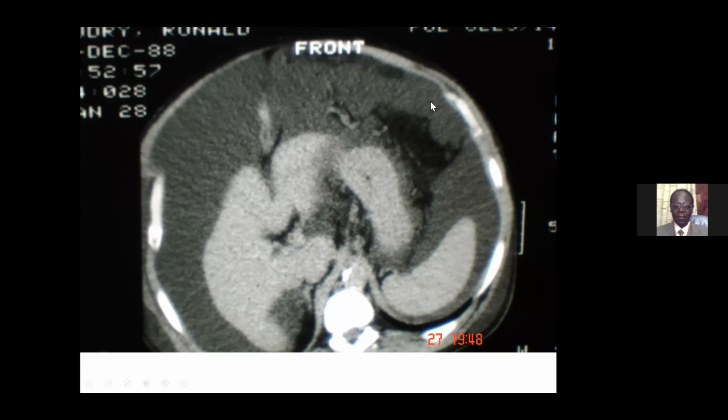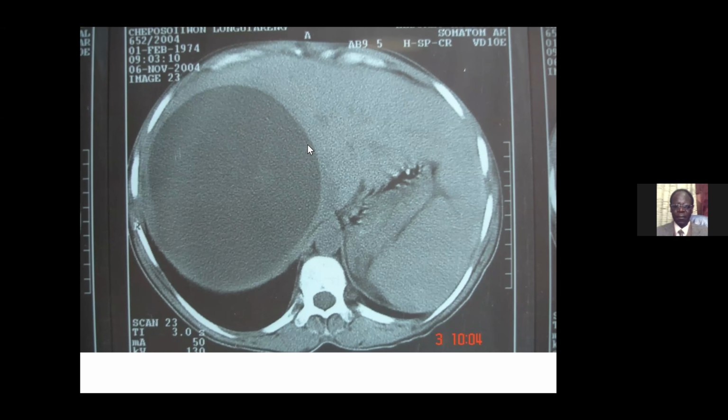This patient presented with abdominal distension. We did this CT, and we found a hypodense cyst, which was quite large in the right lobe of the liver. Look at the liver. The left lobe has been pushed all the way to the left costal margin, hepatomegaly due to this cyst. These are rugae in the stomach. This is an enlarged spleen.